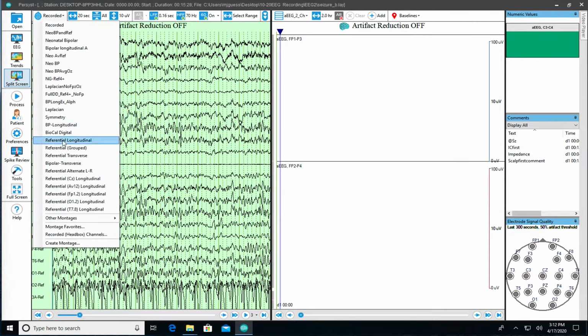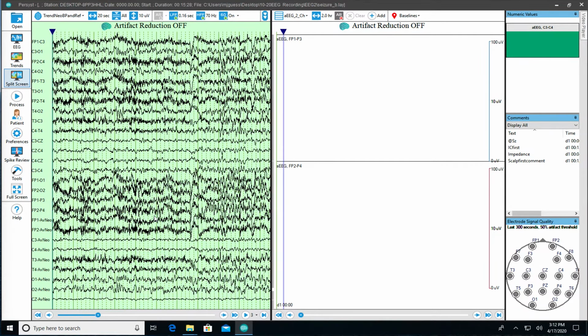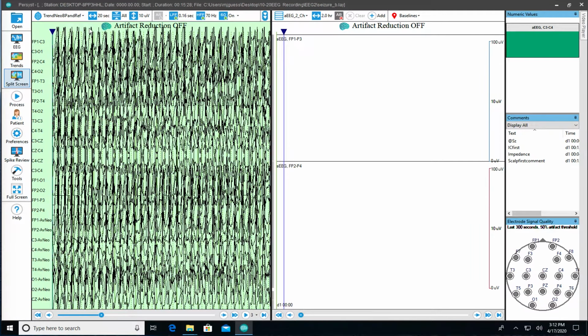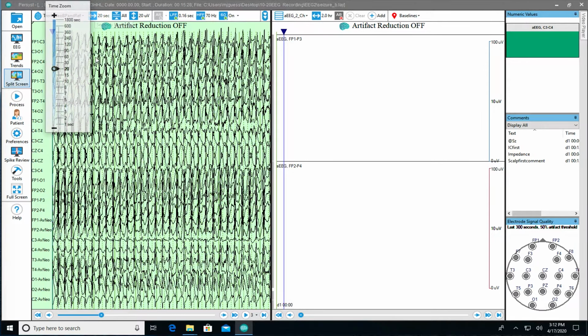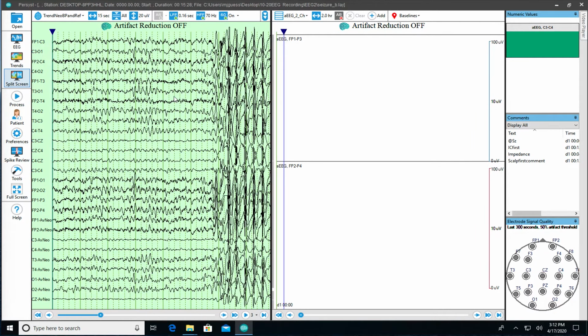I want to pick that trending montage. There it is, trend, Neo, BP, and Ref. And why didn't I leave it in the list? Because I don't want this to be inadvertently modified. It has a job to do. And so there's that seizure there. We're looking at 20 seconds of EEG, as we would typically with neonates. We can change that. But yeah, you can see that seizure there.